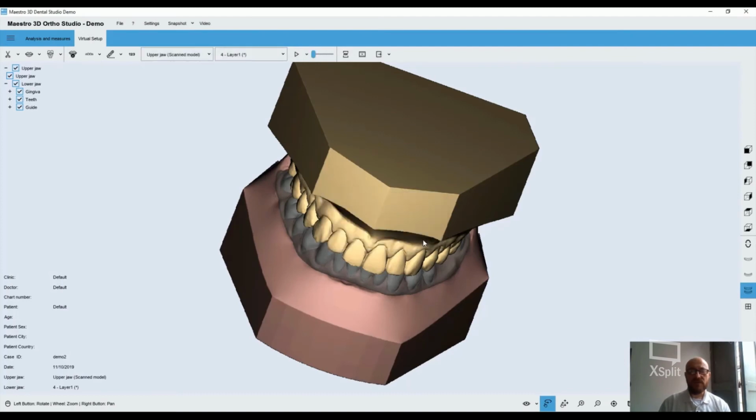Thanks a lot for your attention and for your time. And now Filippo, my colleague, is going to show you how to print out these transition models and the aligners with the AccuFab 1 3D printer provided by Shining 3D.